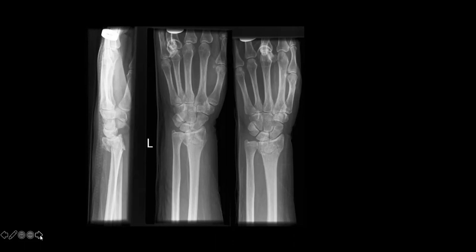So if we're describing the fracture now, we need to comment on whether it's intra-articular or not in the first place. So i.e., does this fracture extend into the joint space? And this is of particular importance to the surgeons as they make decisions on whether to operate or not and what operation to do based on an intra-articular fracture. So if you trace the lucent line of the fracture, you can very much see that it extends into the joint space. So this is what we would describe as an intra-articular fracture.